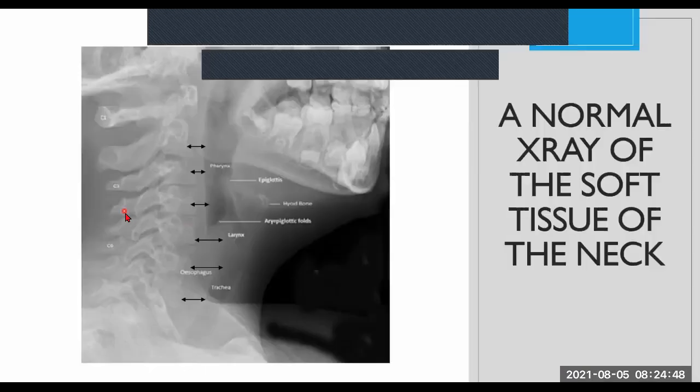So the first thing we need to know is we just need to know the normal anatomy. Right? Can you guys see over there? This thing is not moving anyway, so it doesn't make a difference. All right. So we'll cover the distances just now, right? But these are just the normal distances. But I'll show you the exacts in a little while. The more important thing is to understand what you're looking at.